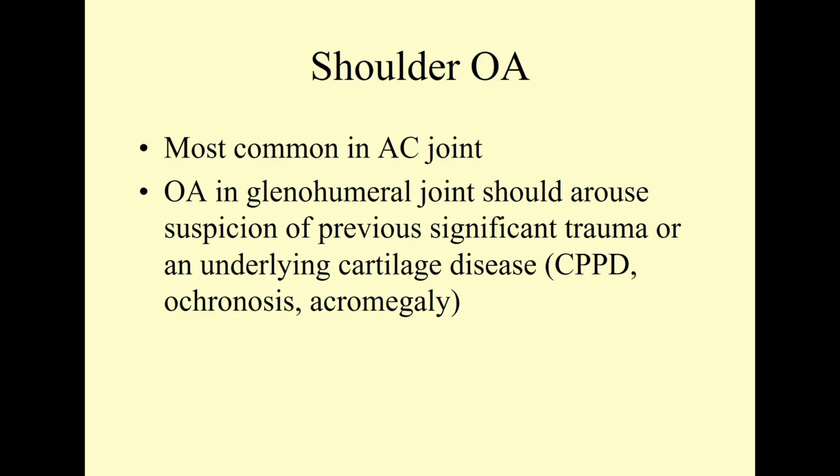But even on non-weighted views, the AC joint will gap open. And again, we're signaling the post-traumatic scenario. If we were dealing with DJD in a weightlifter, so no traumatic events, just a lot of wear and tear, what I tend to see is the more classic reduction in joint spacing, subchondral sclerosis, and marginal osteophytes, and the occasional subchondral cyst.